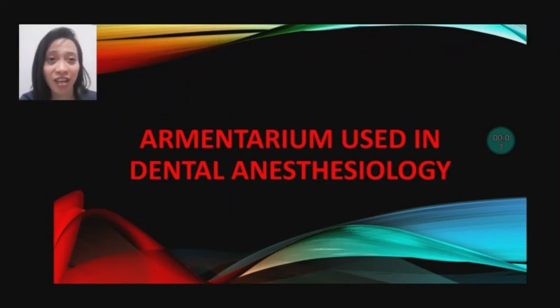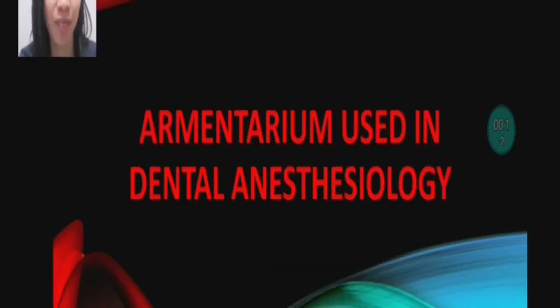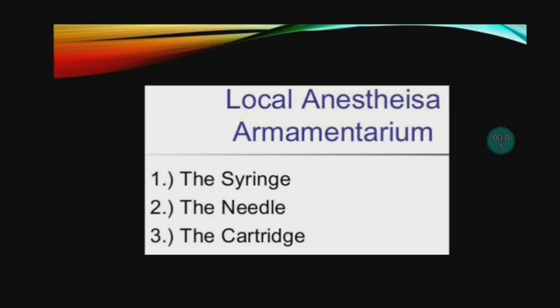Good day. Today, I will be discussing the armamentarium used in dental anesthesiology. These are the local anesthesia armamentarium: the syringe, the needle, and the cartridge.